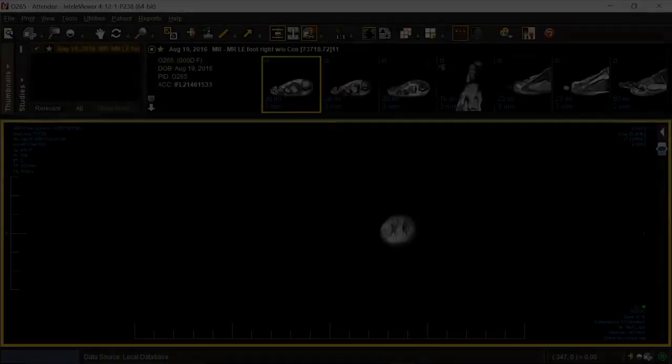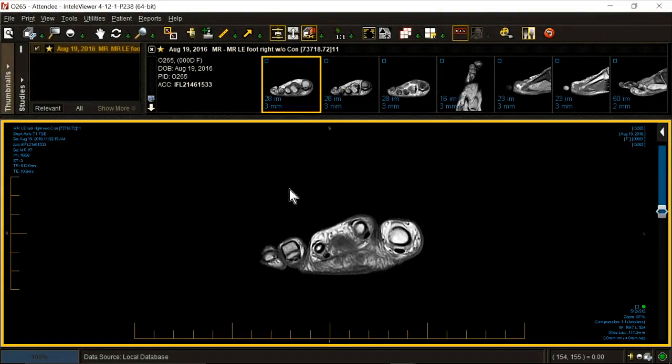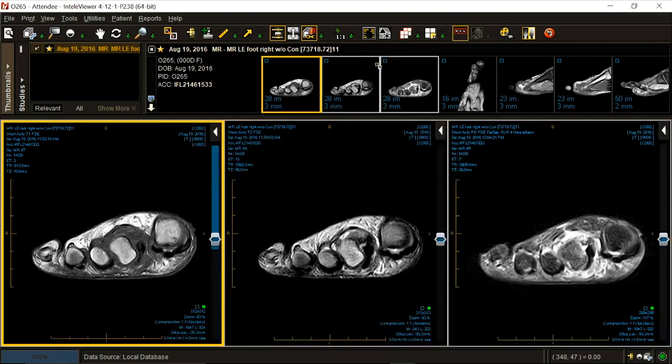Actually, can we go back to that one? I apologize. There were several other findings I should have shown. A little too overeager. My apology.